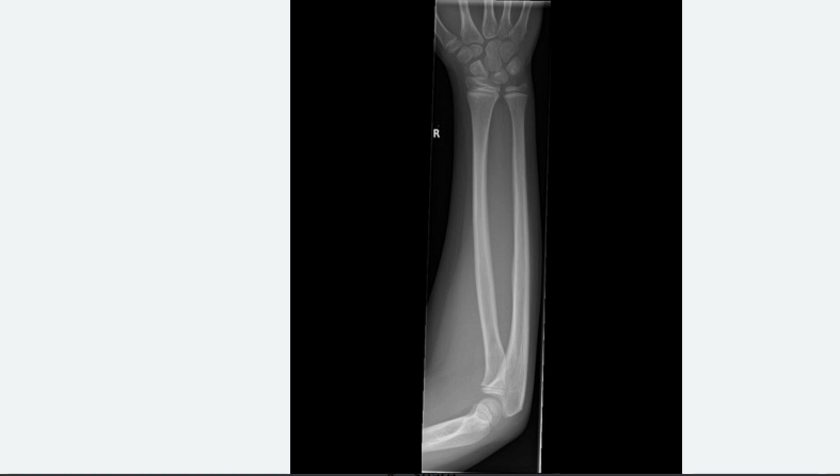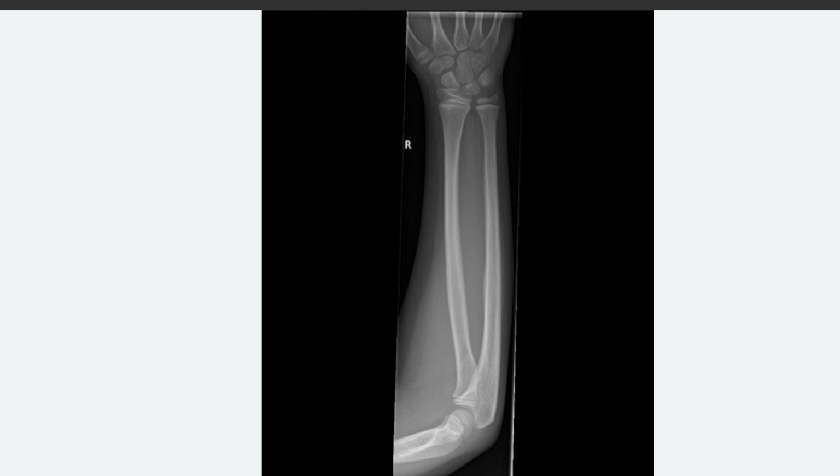Cortex, the cortex should be continuous and most thick in the diaphysis while thinning and virtually disappearing as a line in metaphysis. Note its continuity, especially break in it, its thickness, damage, lytic neoplasm, deformity, widening in Paget's, thinning in osteoporosis, and bowing in rickets. Finally, note if any implant is present and reason for it. Note the non-union or delayed union, change of union, malunion.